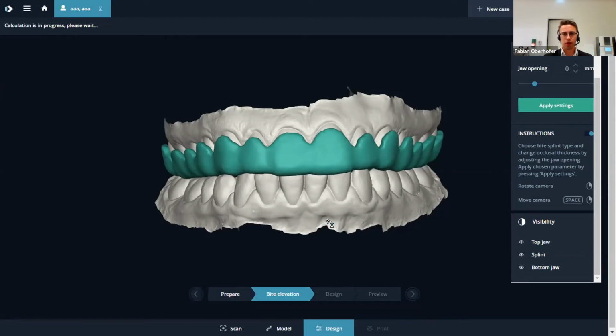And I think this is the point which takes the longest calculation time, but it's not so long, and we could use it for other things like preparing our printer, for example. Of course, I have prepared the printer before this, before the Interdentale, but we could do this now. So still calculating. My PC is running on highest mode. And now we are in the next step.